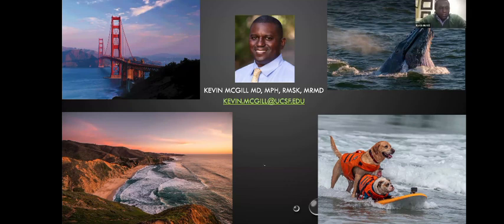Yeah, I think if there's any signal, I'll usually call some sort of injury, because the normal ligament shouldn't have much signal in it, especially if the patient has had an injury there or had some lateral ankle pain, and it has high signal. If we're just talking about grade 1 injuries, obviously for the higher grade injuries, we're looking for more abnormality within the ligament itself.